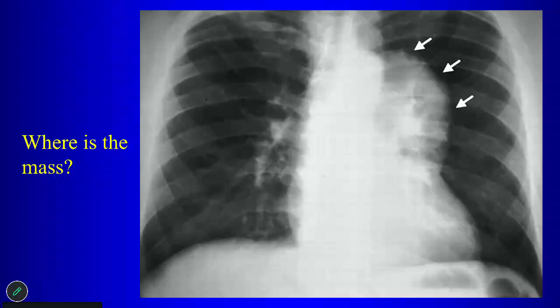Anterior is part of the clavicle. Could you apply that principle? That's the cervicothoracic sign, right? But this mass does not extend above the clavicle to be able to use that sign, right? The mass has to extend above the clavicle first to be able to use that sign.